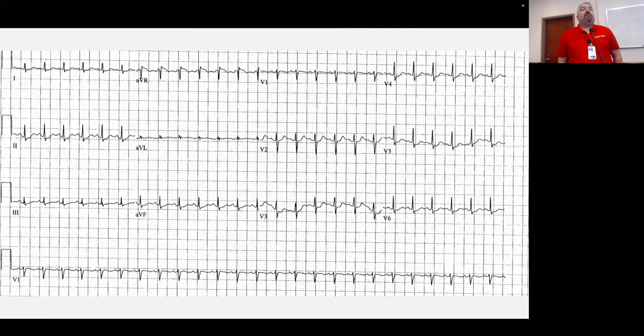Bueller. Okay, so that lets us know that it's actually coming from the sinus node because it's coming from the top part of the atria and coming down. There are other foci in the atria that can fire, and those are going to have a different P axis, and we'll look at one of those in a minute.